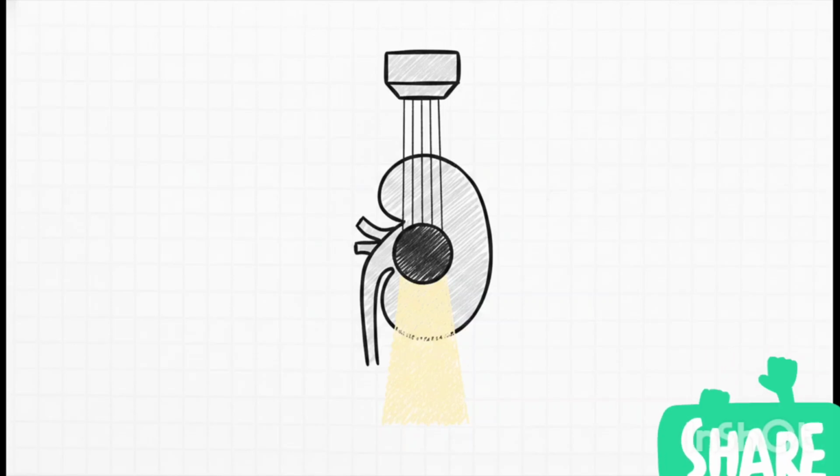Let's see how this builds our visual vocabulary even further. Remember how those dense kidney stones cast a dark shadow? Well, simple cysts do the exact opposite. Because a cyst has no internal echoes, since it's just clear fluid, the sound waves travel through it incredibly easily. This causes the area immediately behind the cyst to appear artificially brighter on the ultrasound. We call this posterior acoustic enhancement. It's a fantastic visual clue that confirms you're looking at a harmless pocket of fluid rather than a solid mass.